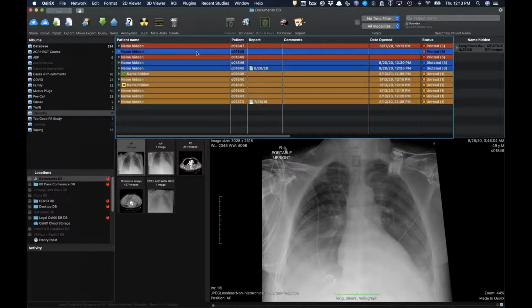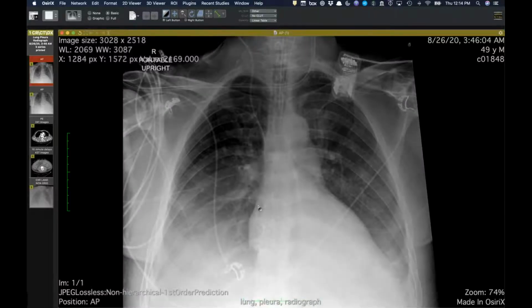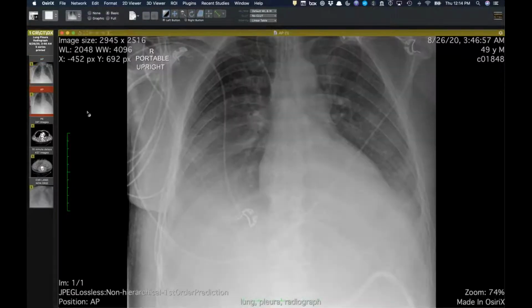All right, this is a really cool radiograph. I've mentioned this before, and I know others have mentioned this. I think this is maybe the best example of this that I've seen in a long time. I always tell our fellows and residents, be careful about overcalling pleural effusions on radiographs. I wish we could poll the audience right now to see how big we think each-sided pleural effusion is in a case like this.